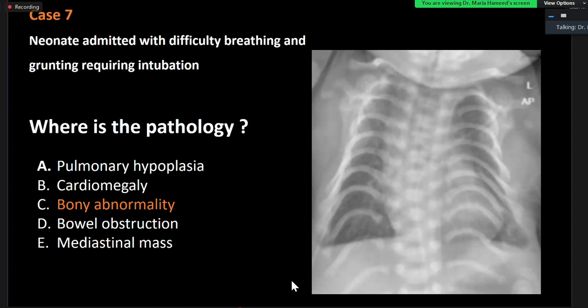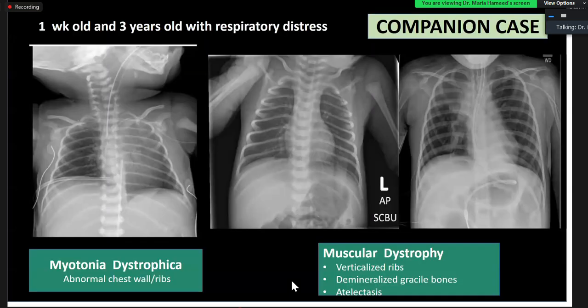symptom. So here you see the bell-shaped chest. Chest shape is very much funky, and it's bell-shaped, narrow, with slender ribs. Look at the ribs' orientation. These are curved and slender. Again, the lungs are hypoplastic. And have you ever noticed this clavicle shape? Which shape is this? Handlebar clavicles. So this is a case of Jeune syndrome. So you need to look for all these entities.